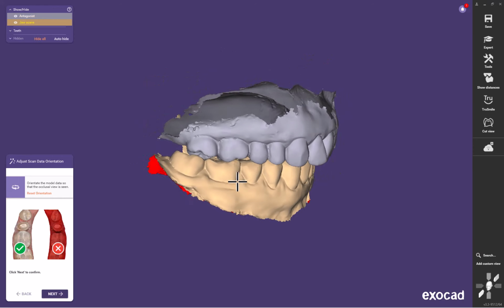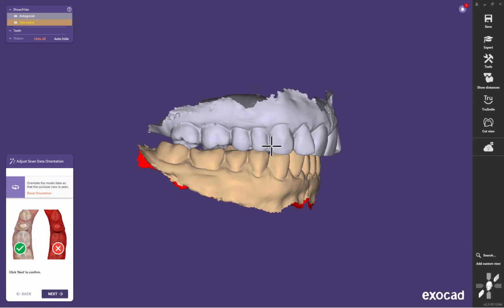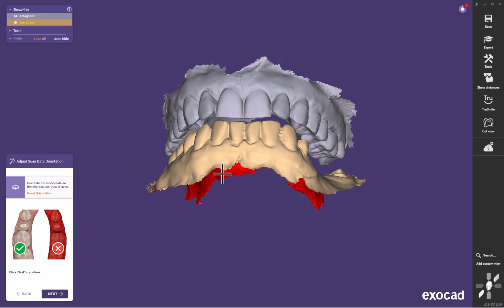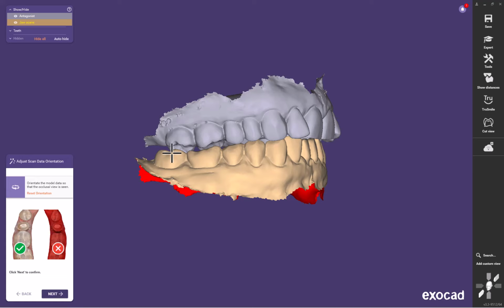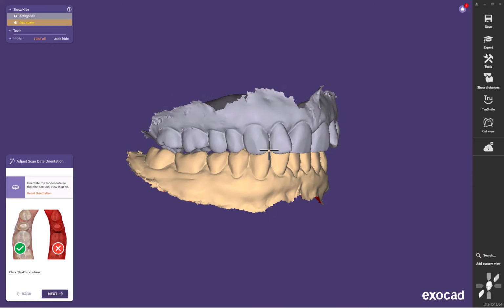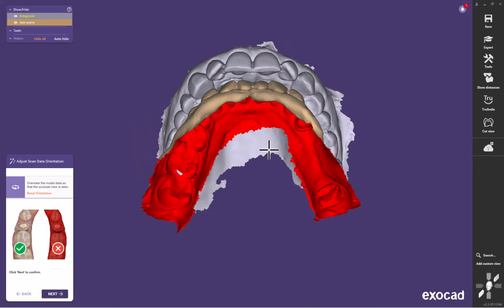Now, why is it that we capture the first point of contact back here and she feels it in the premolar area? Maybe this tooth is mobile. I'm going to go back now at my re-exam and see if this tooth has some mobility, and exactly why she's feeling something different than what we're capturing. But nonetheless, this becomes a good exercise in figuring out what I can do with this occlusion.